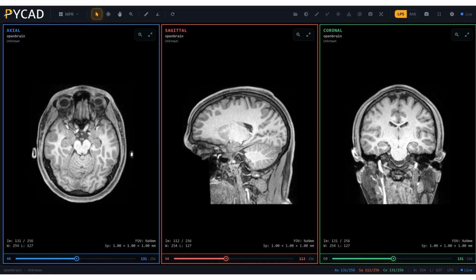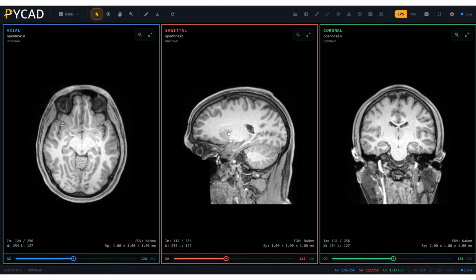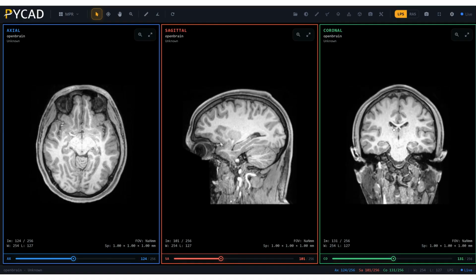And basically, you have something that is standard in most DICOM viewers. So you have the MPR here, so axial, coronal, and sagittal views. You can scroll through them. You can go to a specific slice and do some analysis on it. But usually, this is just the starting point for the workflows that we build for our clients. What we do after this baseline is adding things like AI segmentation overlay or building presurgical tools or some other tools depending on the use case.